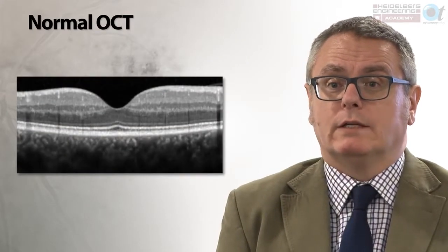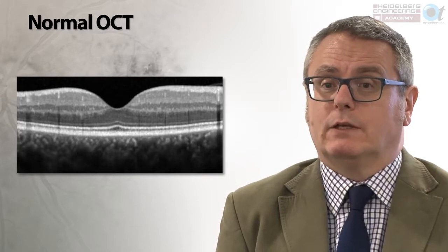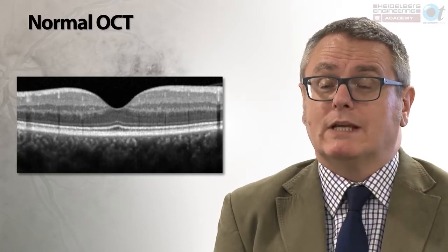Okay, we're now going to look at normal OCT structure and what we're actually visualizing within the OCT scan, and to think about the anatomy and the importance of that or its significance when we're doing OCT scans. So what does the OCT image actually represent?